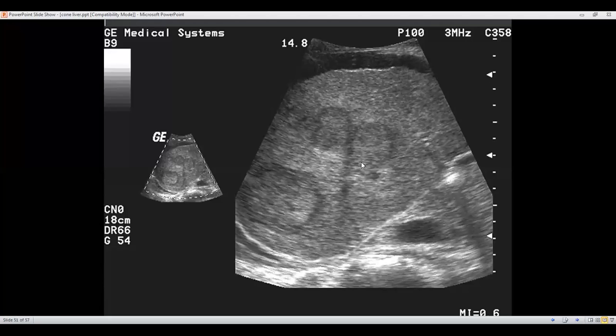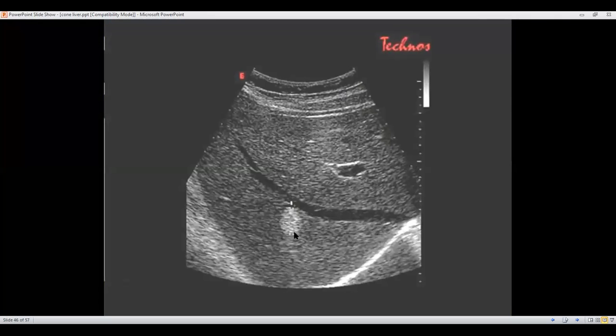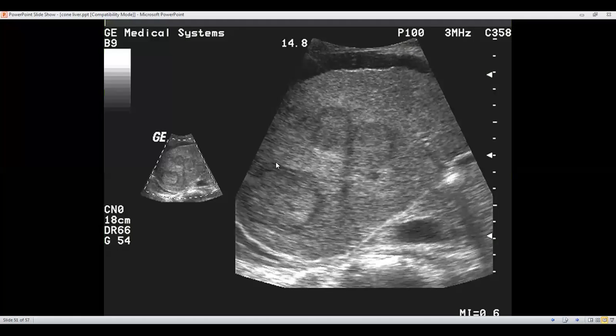You can see here the bright nodule surrounded by a black halo. This is how we see malignant deposits. But do we see any halo around this lesion? No, there is no black halo. This is how a benign capillary hemangioma will appear. A benign capillary hemangioma is very bright, but without any black halo around. While here you see the clear cut halo around.